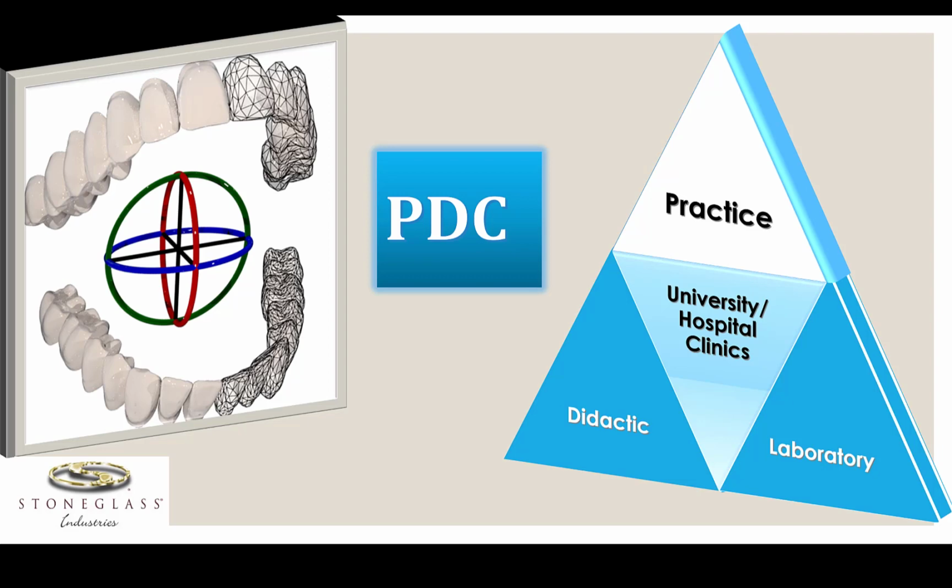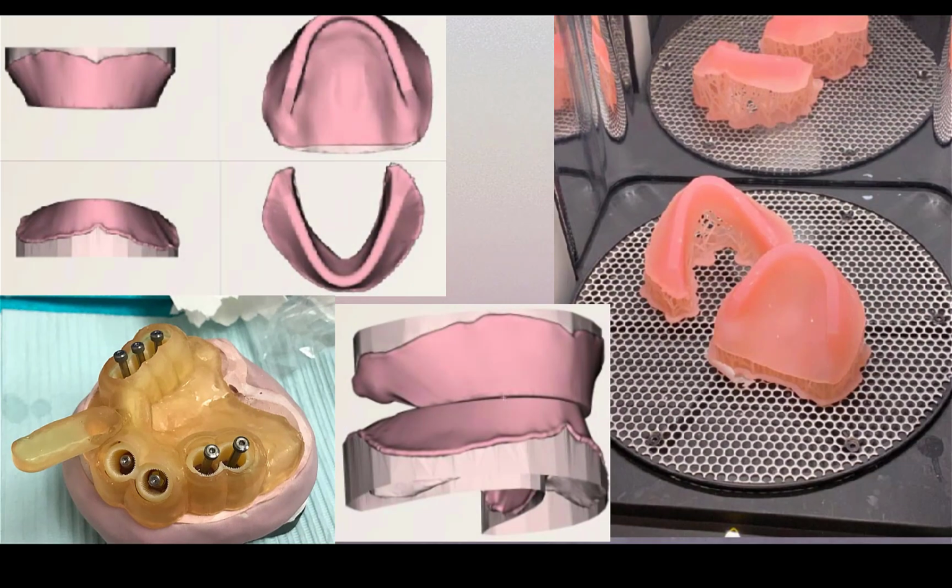The software was not built for engineers and technicians. It was designed with the clinician in mind and with occlusion as its centerpiece. For instance, in the area of complete and partial dentures, if desired, occlusal rims can be designed and printed. Adjusted resin rims or traditional wax rims can be scanned into the software so that they may act as a guide or overlay for the placement of virtual teeth.